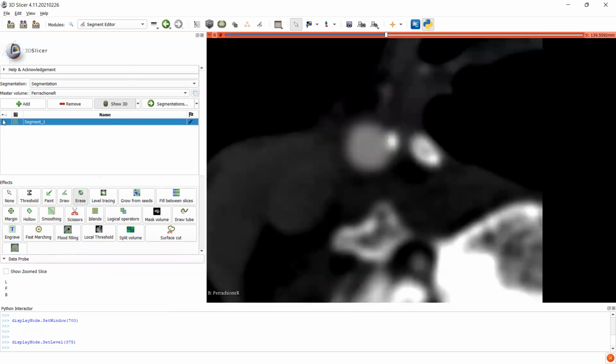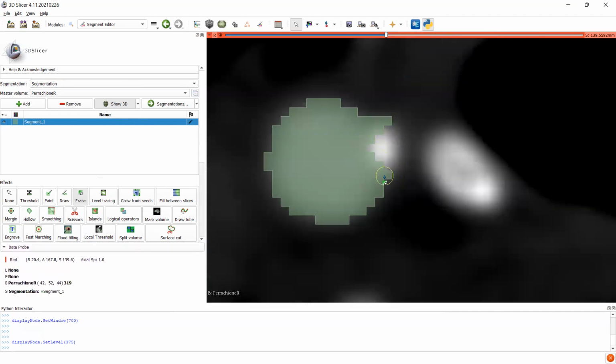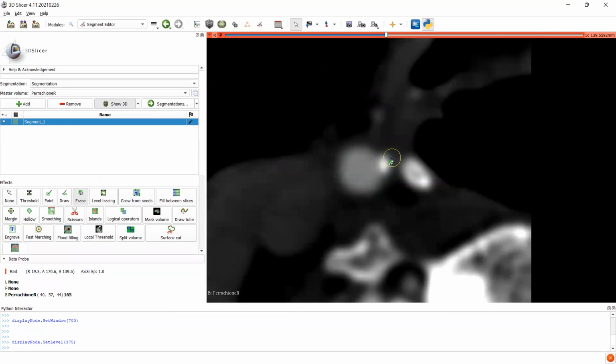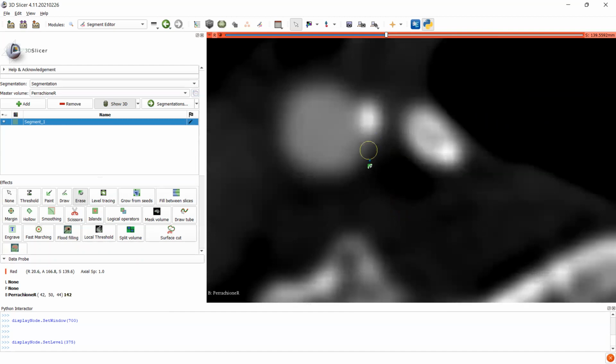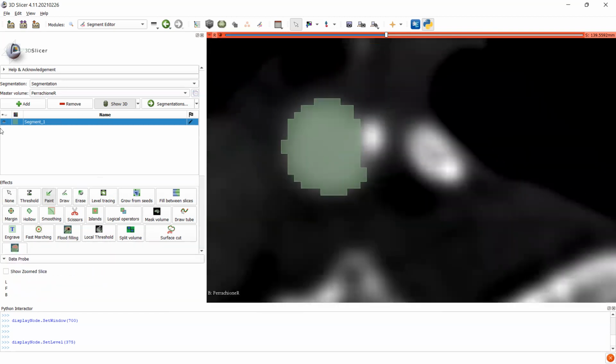I prefer not to look at the sites. You see, this right here is not flow lumen, neither is that. So again, you kind of want to go back. You can see there's kind of this region. There's lower values right here. There's lower values right here. And it's almost, there's plaque right here. So probably a line about right here. To the left of it is flow lumen, to the right, it's not flow lumen, you want to erase it. So that's fine. If I want to be really petty, probably goes up to there. You can see that.